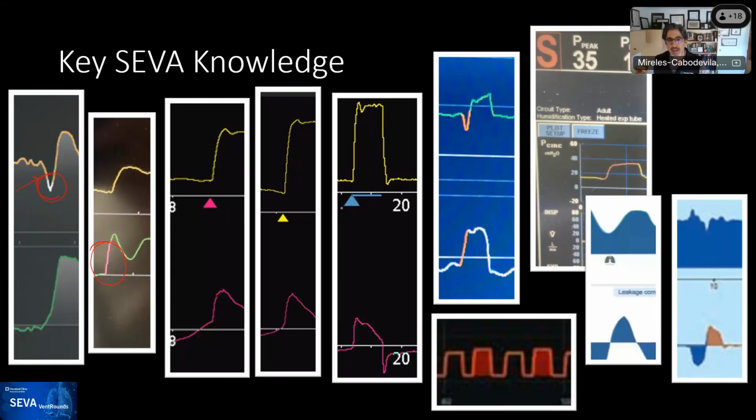So the trigger is done using an algorithm from the machine that decides how to trigger. I'm not privy to how IntelliSync triggers itself, but it's there. And you can actually see a blue line happening afterwards, and that means the cycle threshold is also automatic. So now they're giving you two pieces of information for how it's set. This is IntelliSync for trigger and for cycle. So I put both there for you to recognize.